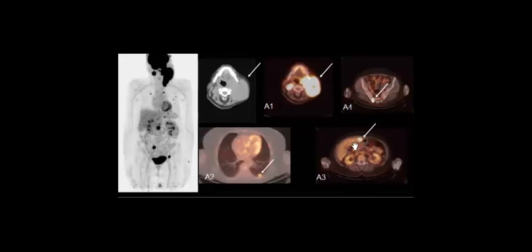So here again, liver lesion, and it's high uptake in the FDG PET/CT, and you can see that there is again a pulmonary nodule. So we have, I see Asma, welcome Asma, Rabab, Reem, Ala, yeah. So you collect everything and finally, yeah. So let's make a rule. There is a tumor when you find the lymphadenopathy.